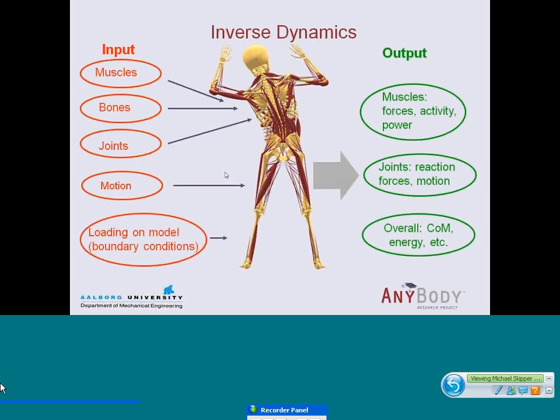And then from this, you want to compute the muscle forces, activities, power, joint reactions, and so on and so on, and all the derived variables from this. This is the overall framework.